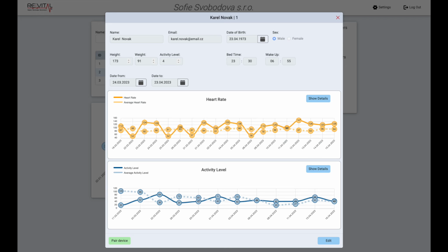The top one, in light orange, shows the patient's heart events and heart rate. The dotted line represents the average adjusted circadian rhythm, with the solid line representing actual readings from smart wearables. The bottom graph, shown in blue, represents the patient's activity graph. The dotted line is the average calculated over a long period, with the solid line being the data retrieved from smart wearables.